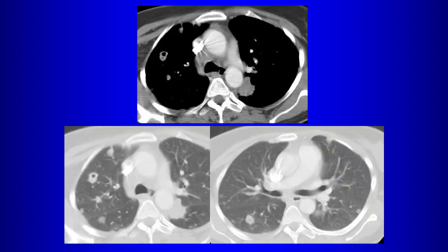Somebody said HPV. Is that a good answer? Yes or no? I think they cause cavitary lesions, but you would expect papillomatosis in the airways. Do they have thin walls or thicker walls? Thin. Not a good answer. Okay? And one of these is solid, see that?